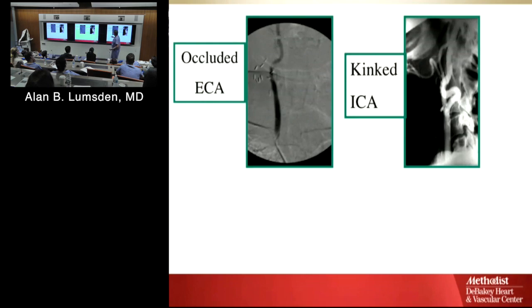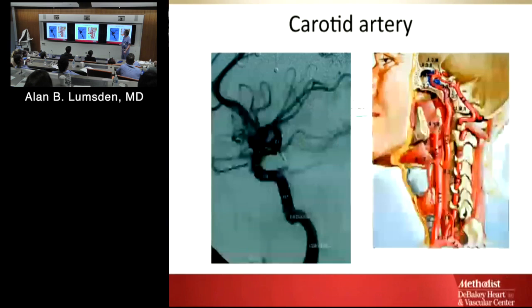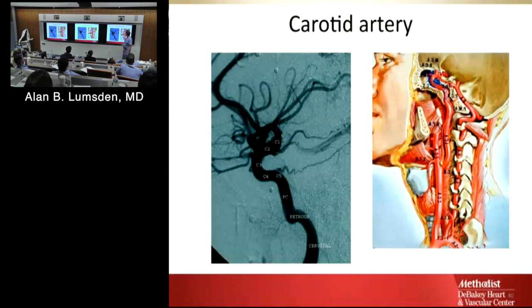But again, describe these things. What region of the neck are we in? A bunch of clips. The patient's probably had an operation. It's not normal. I can't really tell exactly which vessel that is. Could it be a vertebral? It doesn't really look like a vertebral, but at least we're in the right ballpark. So describe what you see.